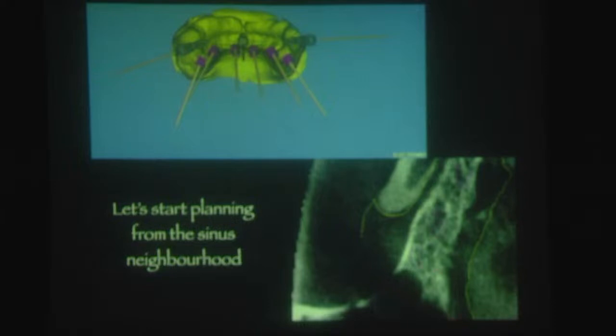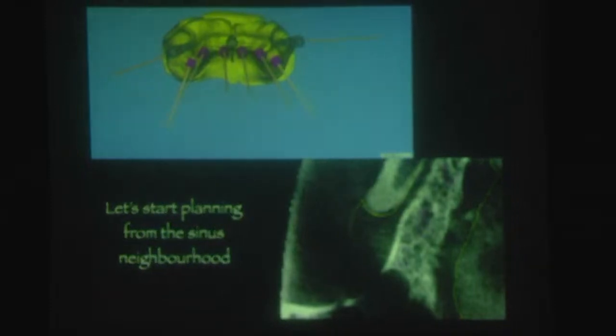And if it is not enough, then we will start making the inclination. Look, we incline to 30 degrees, and we know that using an angulated abutment with 30 degrees, everything will be over and we can solve the problem. So, the guide is ready. You know the procedures: DICOM files, STL files, M-Soft, and planning, and then 3D printer, and here is the guide.